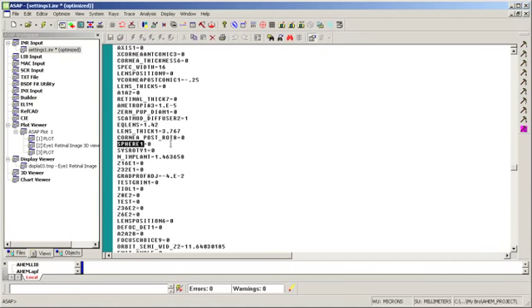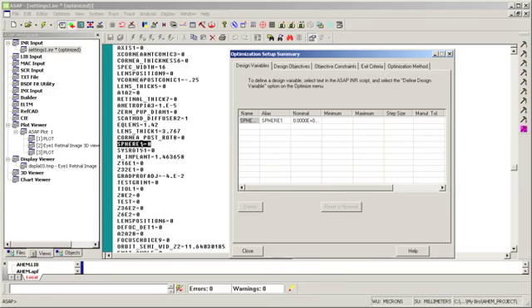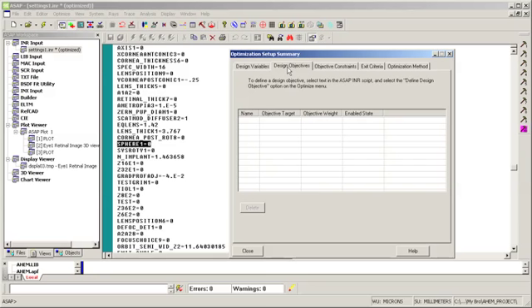There it is. So I'm going to select it, and I'm going to right-click on there, and I'll say Define Design Variable. So its original number is 0, and now the optimization is going to figure out what the best power to put on the correction lens will be. Now my design objectives, I need something to design to.